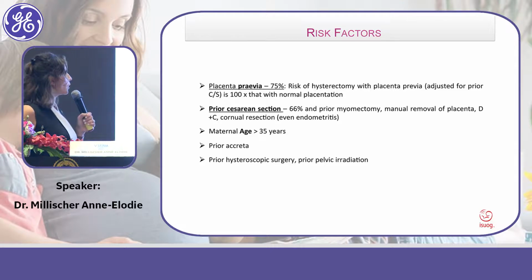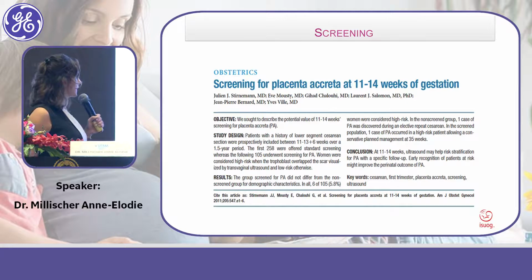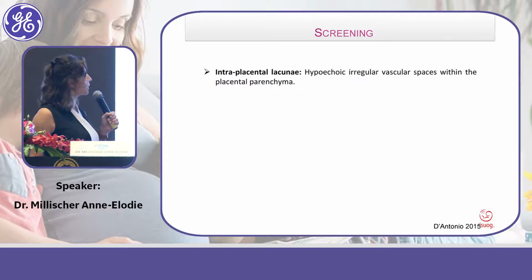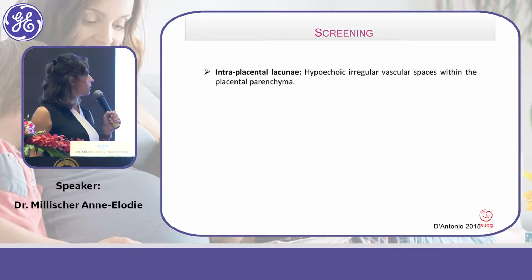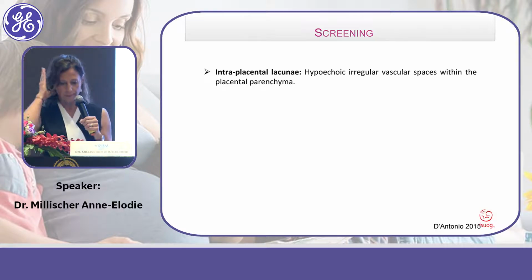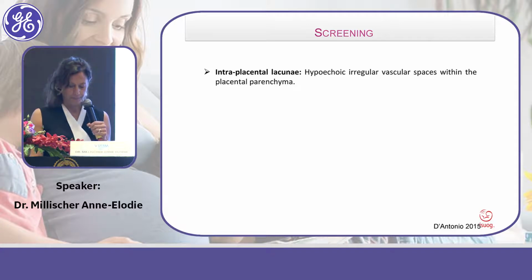Early in pregnancy, we can prevent or suppose the presence of morbidly adherent placenta regarding the aspect of the scar, the location of the scar related to the internal orifice. And if you have this kind of placental insertion, you could be sure that it developed placenta accreta. Và khi mà các bạn gặp một cái trường hợp mà trên siêu âm mình thấy là có một cái sẹo mổ lấy thai từ trước, và có một cái nhau bám thấp thì khả năng cao nó sẽ dẫn tới một cái nhau cài răng lược.